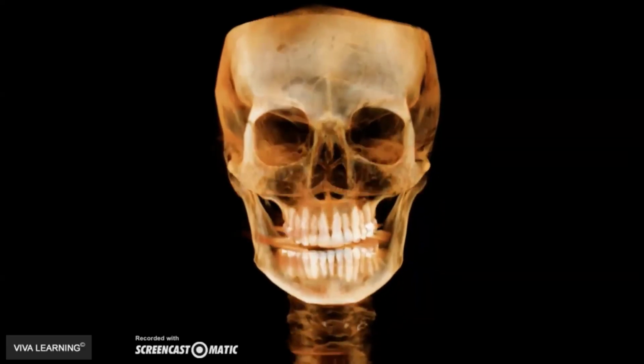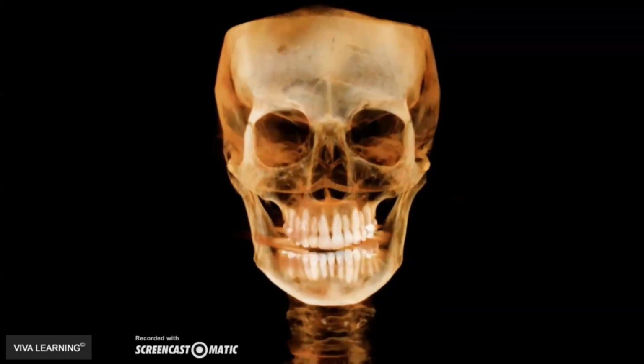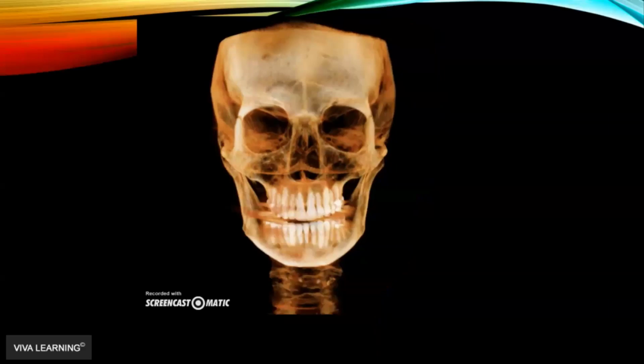Yeah, I think so too. So it is very cool, and patients are able to understand things better in 3D than obviously looking at those axial, sagittal, and coronal images.